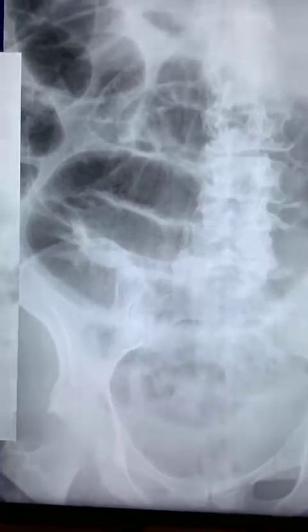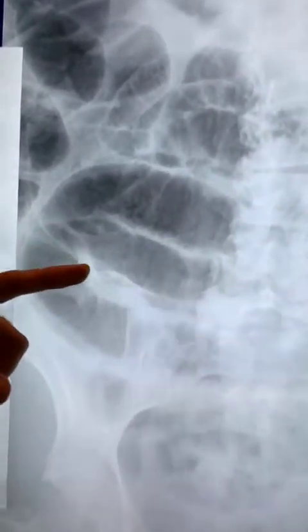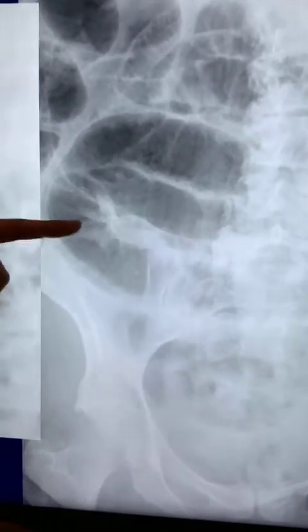This finding that I'm about to talk to you about, pretty much the patient's probably going straight to the OR. They may get some cross-sectional imaging, but I want you to take a look. Let's deal with this loop right here first, okay? You see this is all lucent, meaning darker.